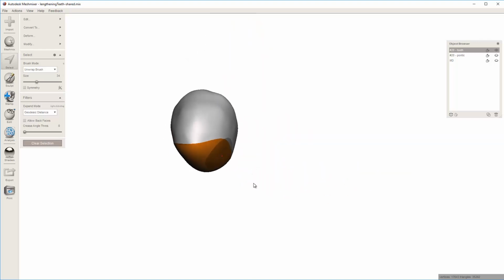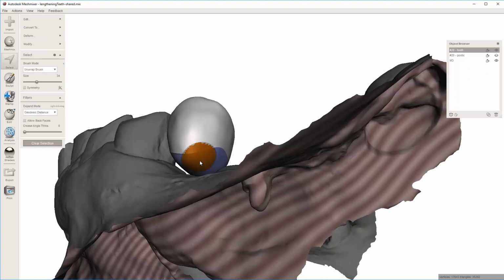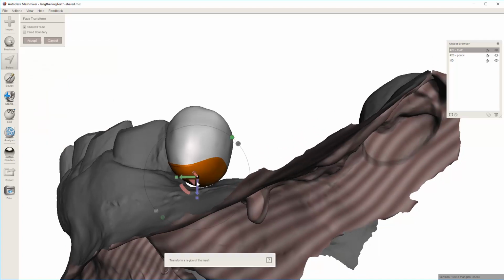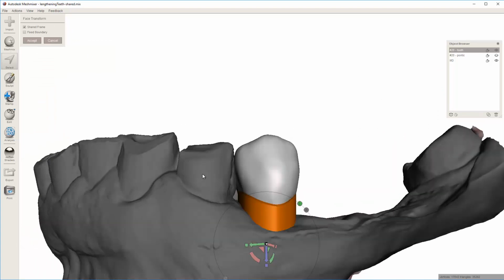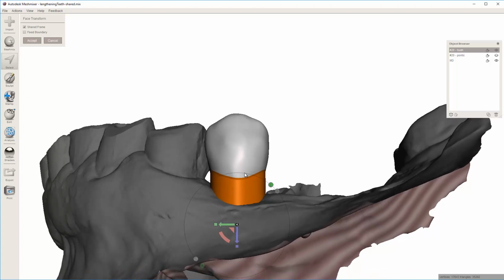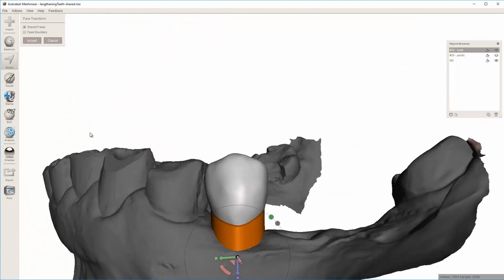Okay, so let's turn the model back on. I can click on that, and now I can hit the Transform button, modify or deform, by just using the T button, and then slide this down. That's one way. That was one of the things that was discussed. It's too vertical, too cylindrical, too straight. It's not very anatomic for me.